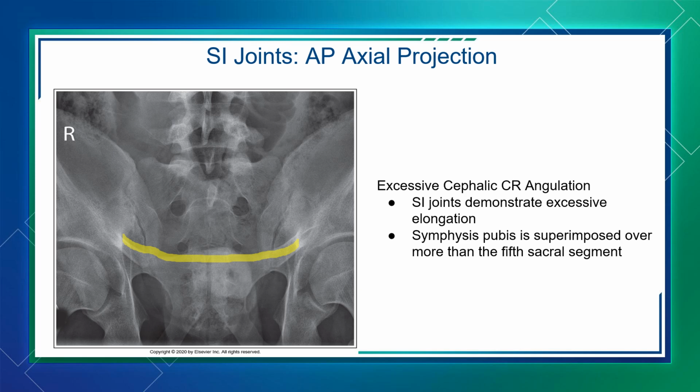And so what we explain to them is that, you know, God makes us all different, and sometimes some of us have more of a curvature in the sacrum than others. In this case, the patient would have less curvature. And so it is the student's responsibility to be able to identify this and tell the technologist that the central ray is actually excessive and I need to decrease my central ray and repeat this image because they are not meeting Merrill's image evaluation criteria.